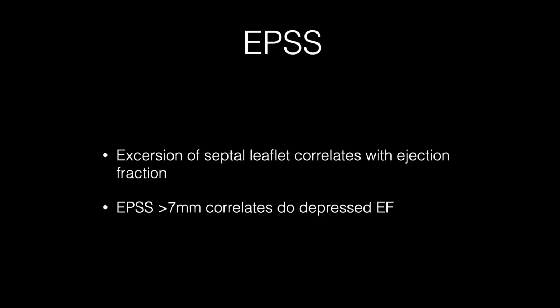So let's talk a little bit about EPSS for a minute, because all that's well and good. I mean, we put that probe down, and we can see between those three different scenarios that there are some obvious differences, right? You can look at one and say, this looks reduced. You can look at the third one and say, yeah, this looks hyperdynamic. But it definitely requires seeing a lot of other scans and a lot of other images to have that mental library, as it were, of normals so that you can detect the abnormal. And with a little bit of practice, it's certainly doable, right?